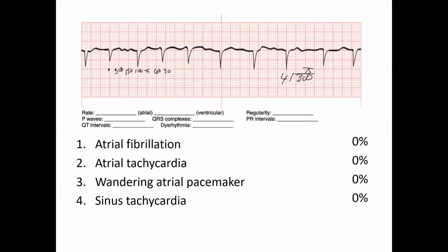So that's rule of 300. And then if you did 1500, there's 4, there's 5, so that'd be 20. 1500 divided by 20, let me double check the math on the calculator right quick, but I'm still pretty sure that's 75. And it is indeed 75.